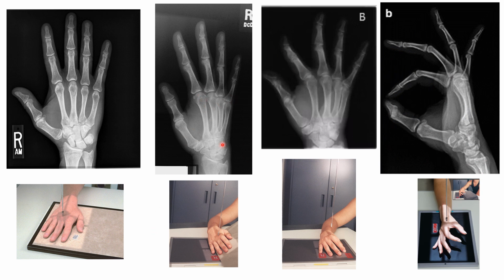Sometimes it depends on protocol where you're working or how you learn how to do those oblique hand x-rays. So we'll be talking about that in a minute. So really it would just be 3 images on a routine hand x-ray.